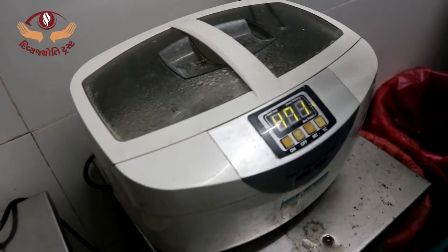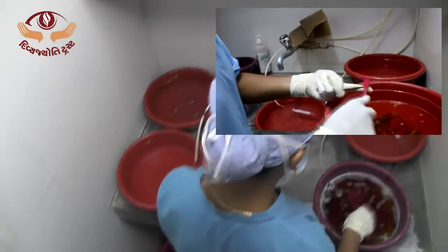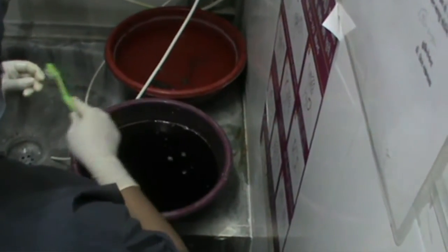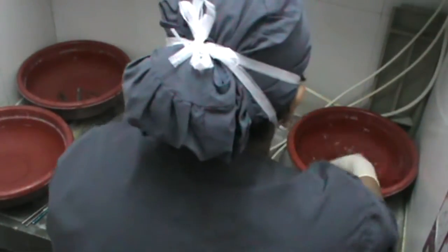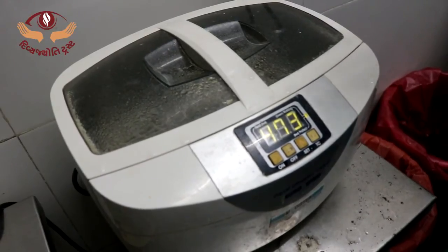Particular attention needs to be given to tubings and cannulas. The 4-bowl cleaning technique should be followed, in which the instruments are first brushed with a soft toothbrush in the first bowl containing mineral water with disinfectant, then rinsed in 3 bowls containing mineral water. This should be done even if the ultrasonic cleaner is used.